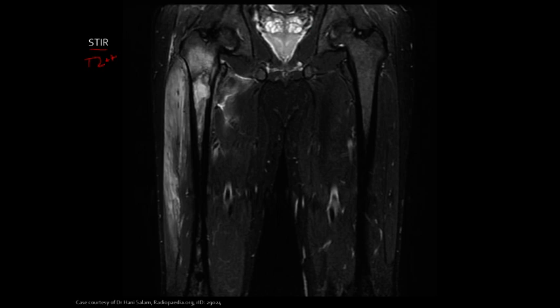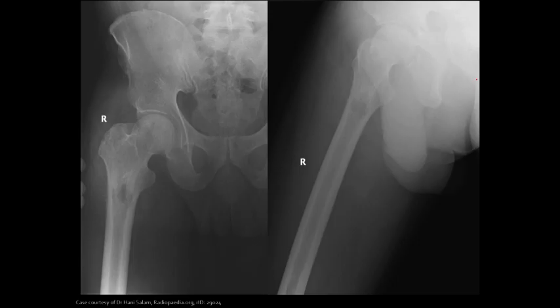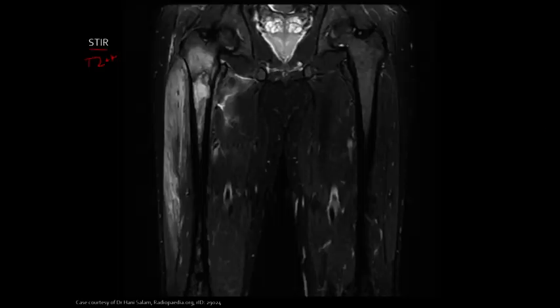So in the pelvic bowl, this is a female, I believe. Yes, this is a female. Nope, that's a male. Yeah, there's some soft tissue structures in this region. So these are more going to be like bladder structures and kind of cutting into part of that. But that's okay. Pelvic bowl, whatever. We don't really care about that. The main changes we're looking at here are the proximal femur.